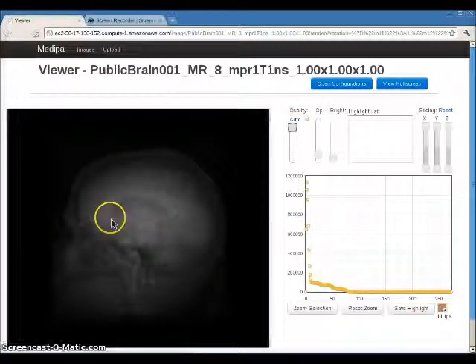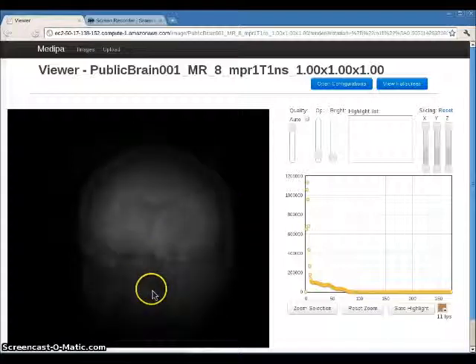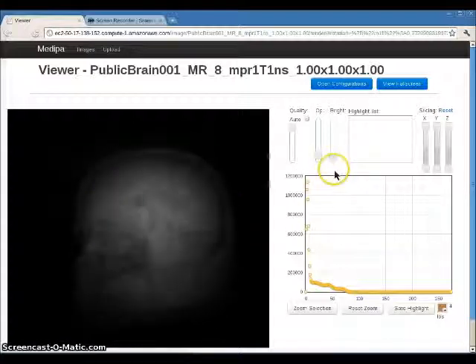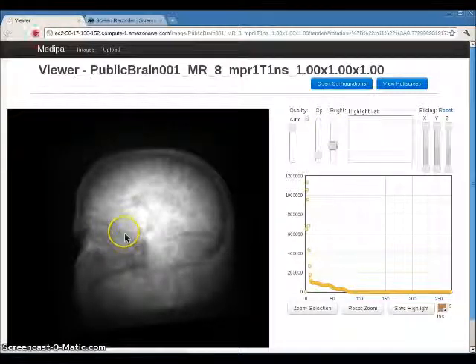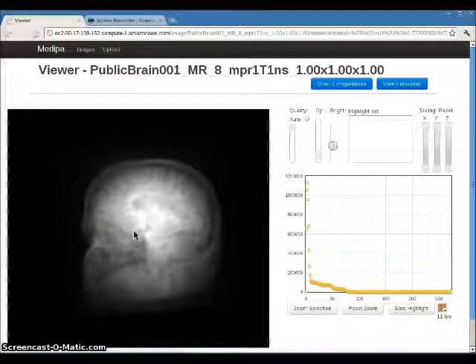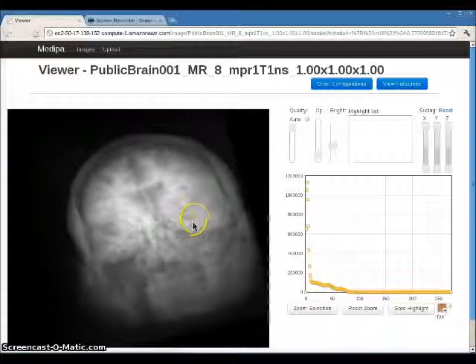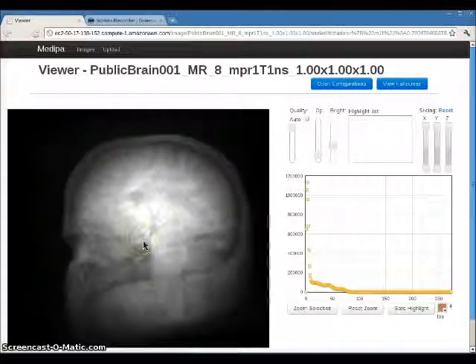The image allows for basic rotation along the X and Y axis, and zooming with the mouse wheel in and out. And generally on a fairly fast system, this happens at a pretty decent frame rate, anywhere from 30 frames per second to 100 frames per second.